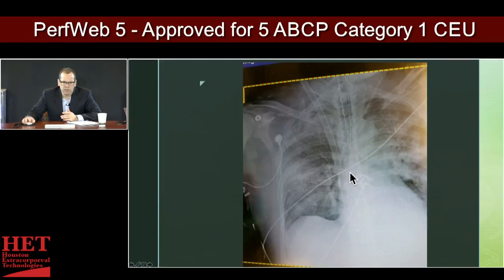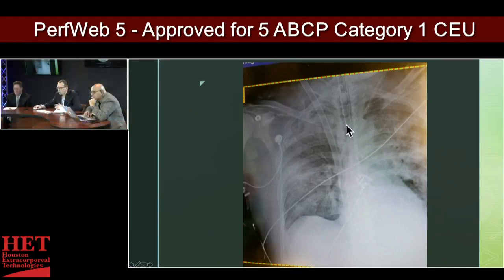So you can see in this picture, this is the knob of the aorta coming up and coming around. This is the left heart border. This is the right heart border coming down this way here. And when you start to have structures on top of structures, it can blur it a little bit. This is where it's nice when you have a digital image, you can mess with the contrast and invert the image, et cetera, to help see those subtle things.